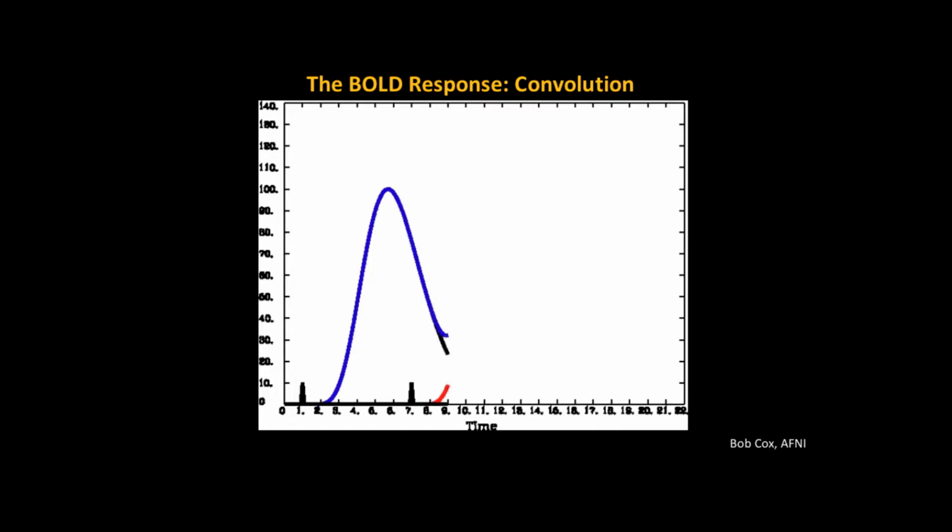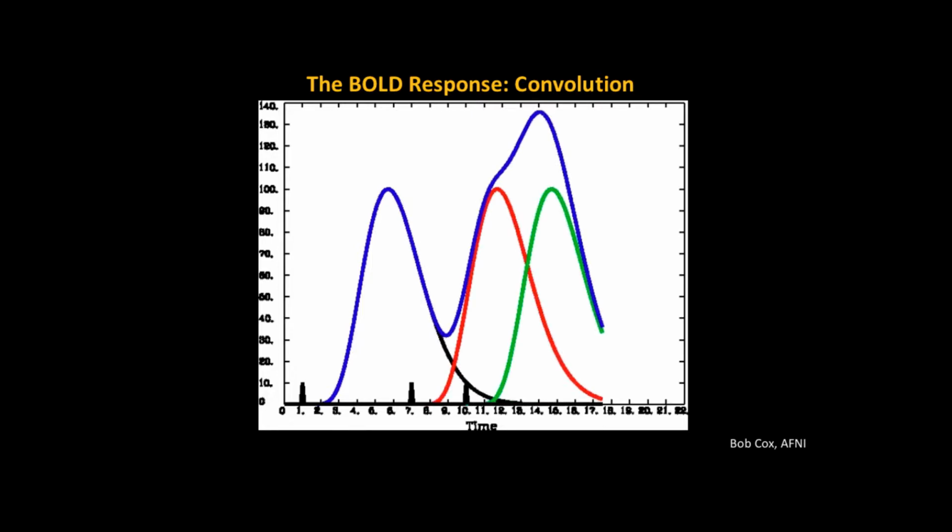Revisiting this just once more. Okay, so remember the noisy time series, what we saw in the AFNI viewer. Our mission in single subject analysis, in 3dDeconvolve, which is the command we're going to use, is to recover what the signal looks like for each condition from this more complicated time series output. Okay, that's the whole idea behind what we're doing.